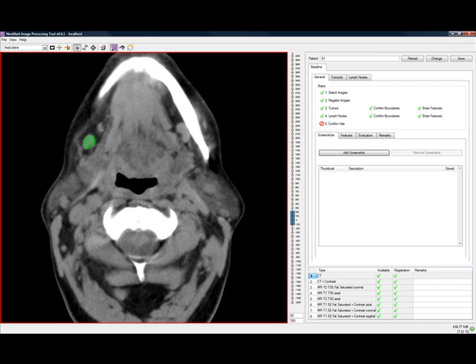Let's take a look behind the scenes. For the automated lymph node segmentation, an initial spheric model is placed at the seed point. Then, gradient and intensity forces are applied that push the outside of the model towards strong gradients and the inside towards typical lymph node gray values. Internal forces, such as spring forces and torsion forces, keep the model together, thereby preventing boundary leaking. This process is continued until convergence is reached.